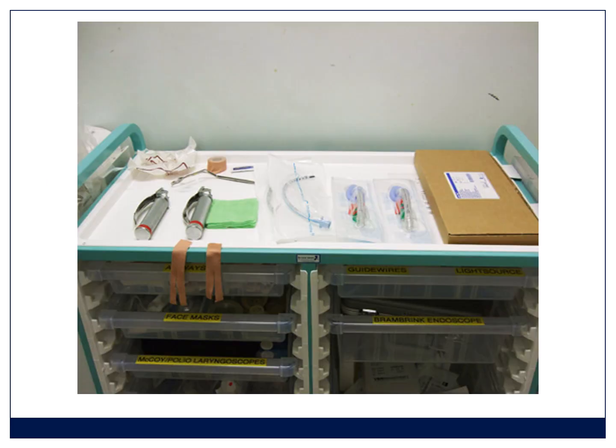The airway trolley, you must know how to set this up. You need a working laryngoscope, ideally 2, different size blades, different size endotracheal tubes, Guedel airways. You need a supraglottic airway device like an LMA or a ProSeal or an iGel, at least a size 3. On the cart, you need a McGill's forceps. So go there, and it's the 5 plastics and the 5 metals. Check it every time.